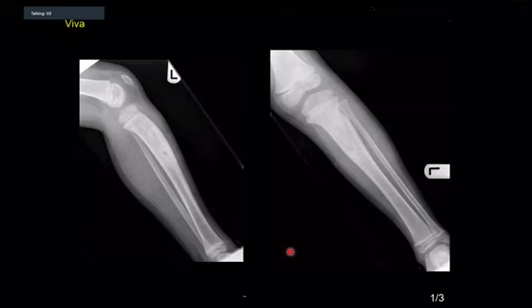On the frontal radiograph, I can see there is periosteal reaction, very subtle. So again, it's a skeletally immature patient. So I am thinking whether this is an underlying infection, and it's the process of infection which involves the involucrum and sequestrum. But again, I would include LCH in my differential as well.